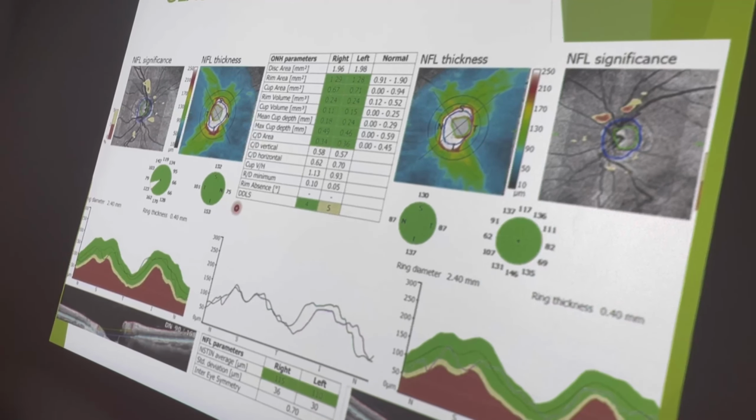And lastly, glaucoma progression. In the OCT, glaucoma progression is detected if the RNFL is decreasing more than 1.7% per year, and if the GCC is decreasing more than 1.3% per year. You can see the percentages 1.7 and 1.3, which indicate a faster rate of loss for the RNFL. So it is the best indicator, sensitive and specific for glaucoma progression, but in early and moderate glaucoma.